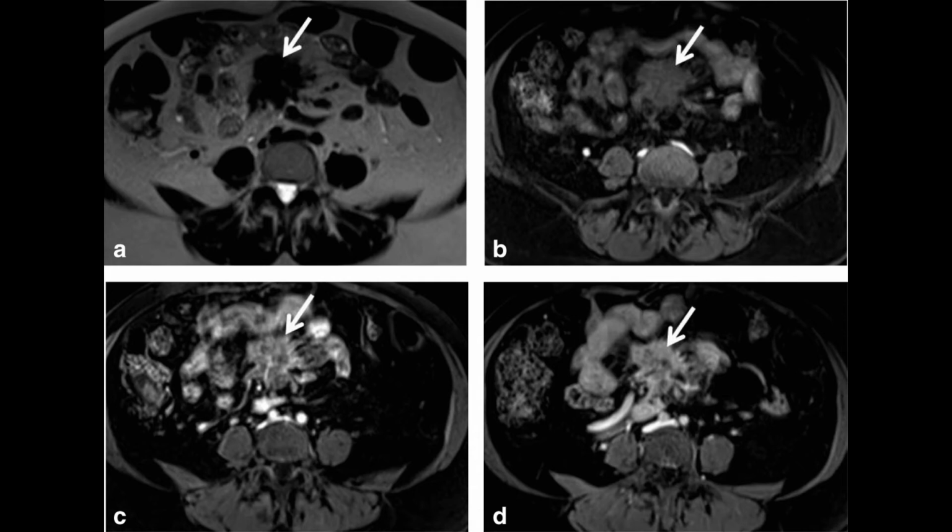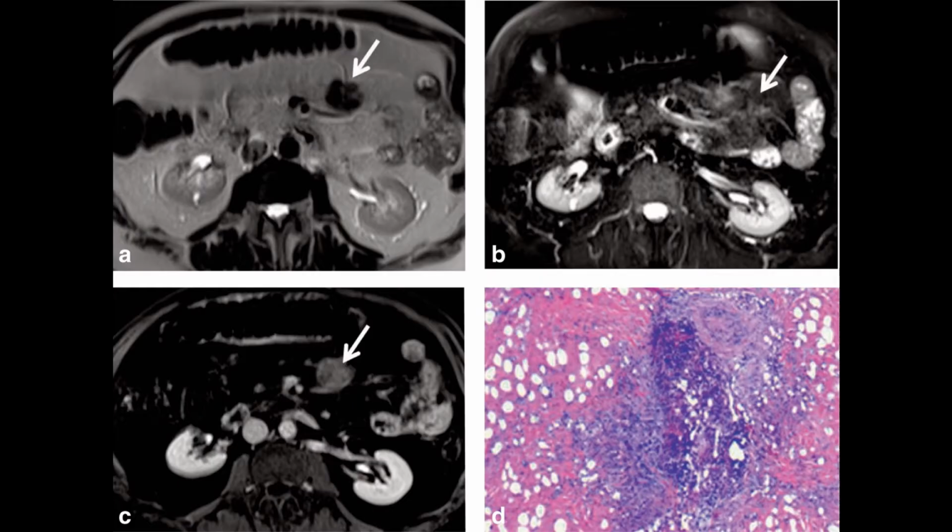The mesentery is inflamed, and fibrous tissue has formed there, and now this is nothing but sclerosing mesenteritis. Okay, the ill-defined margin is what is making us think in terms of sclerosing mesenteritis, because very few conditions have this kind of ill-defined margin. This is not a carcinoid because carcinoid will not have so much fibrous tissue. So with ill-defined margin and fibrous tissue, we think of sclerosing mesenteritis. So that's why this is a case of sclerosing mesenteritis.